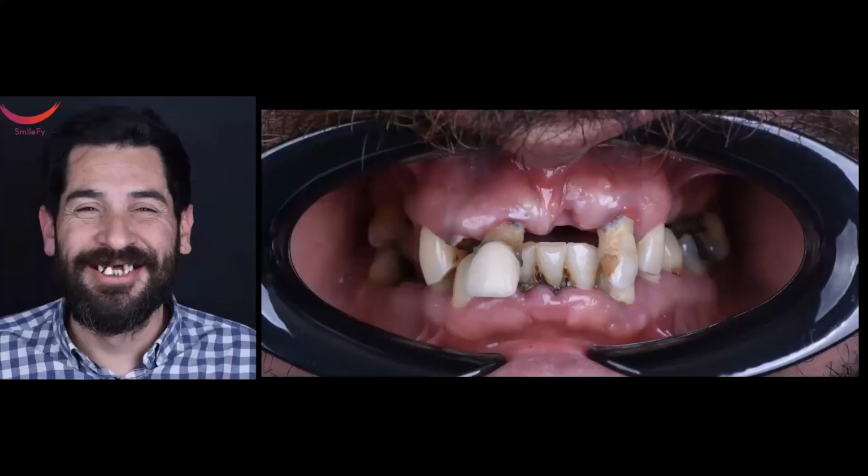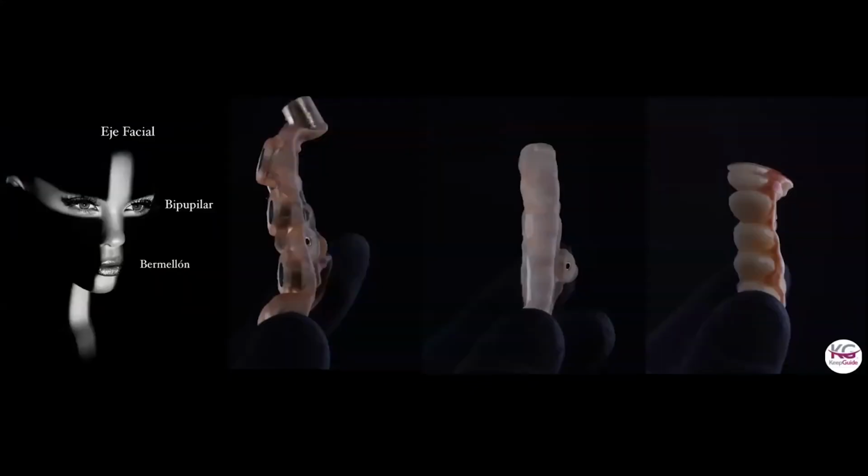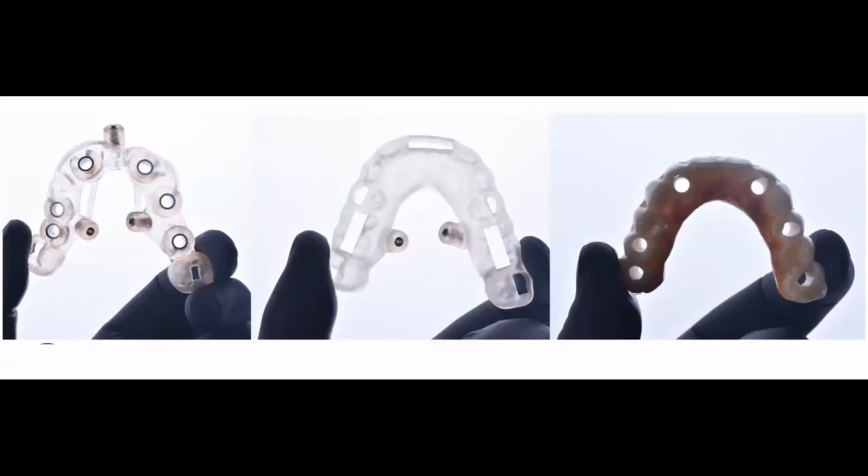Okay, this is the other case, a complex case. It's also a very, very hard case. I love the complex case. The patient came to me for aesthetic problems and other problems. This is the 2D project. The guy designs, I work with Keep Guide design. This is all design driven for the face.